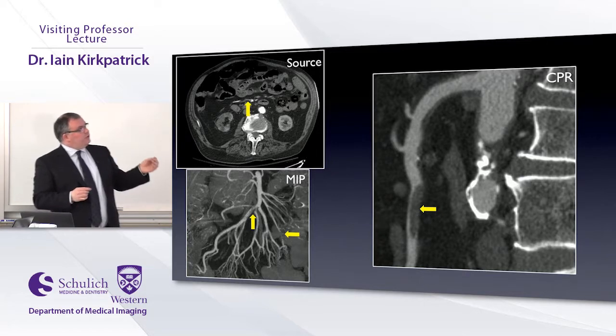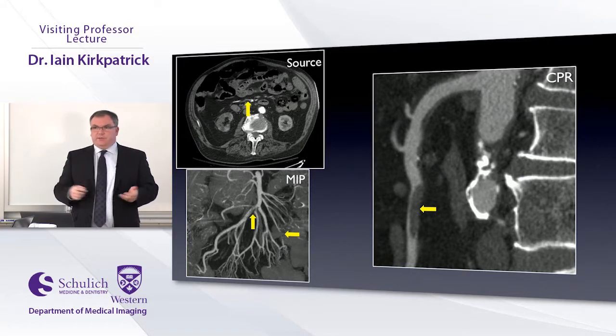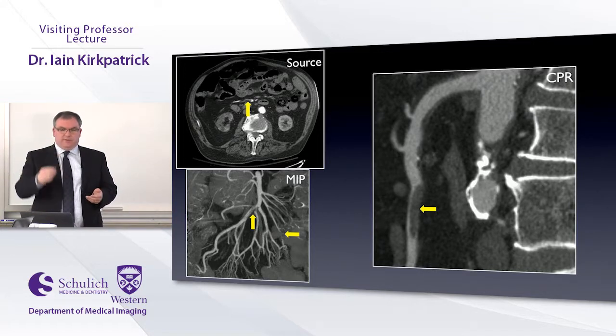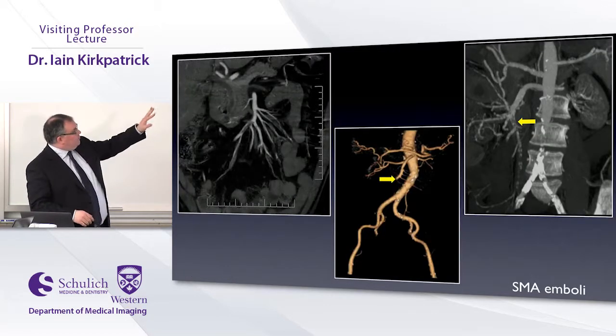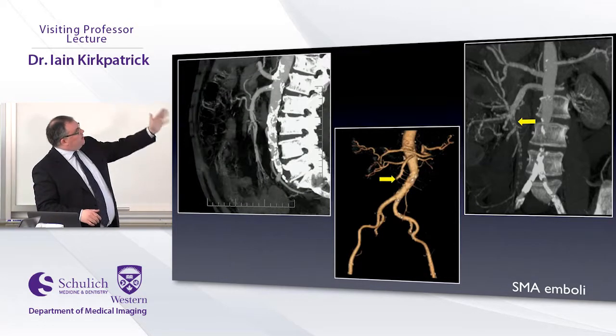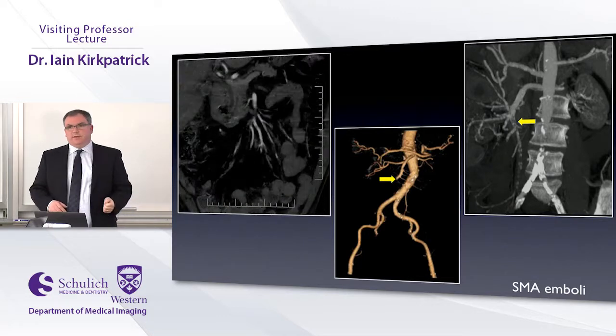Curved planar reformations are useful, especially if you're looking at something that's in the proximal vessel, because they usually come with automated double oblique reformations that let you look down the barrel of the vessel, get an idea for how much of the lumen is actually narrowed. So this is what I do. I'll go to the workstation and thicken and thin out my MIPs, rotate it around a little bit. The lateral aortogram view is kind of nice for looking at the origins of the SMA and the celiac.